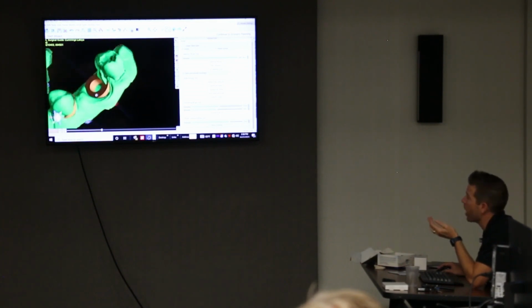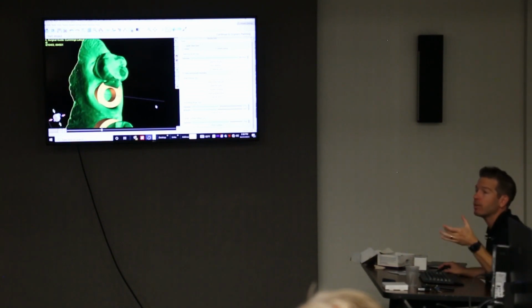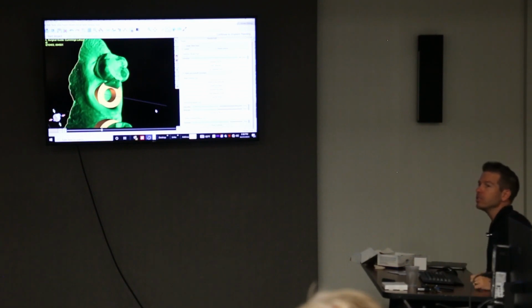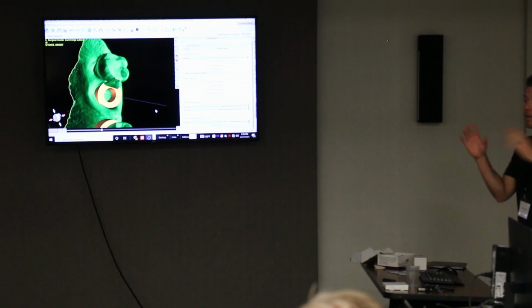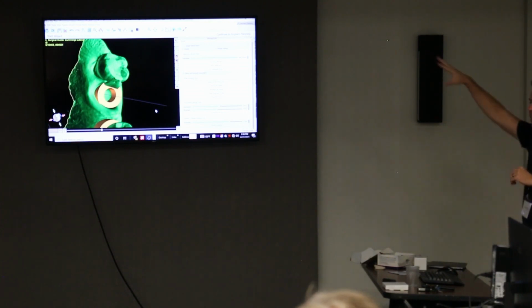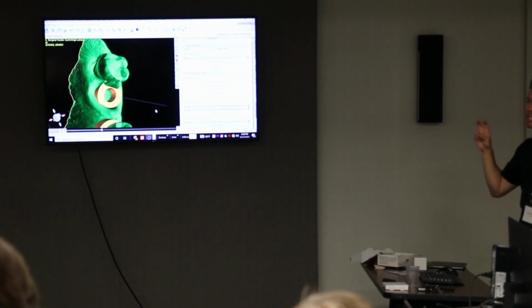Now, when I build a guide, it's going to incorporate that guide tube into the guide, and it's going to take it down into that area. So this is what you do for an immediate implant. Cut the tooth off, then edit the outline and do it in that view, that upper right view, so that you're syncing that outline up above the guide tube, and it'll actually in real time edit your model and create a socket without any complex work. So quick, easy way to do it.